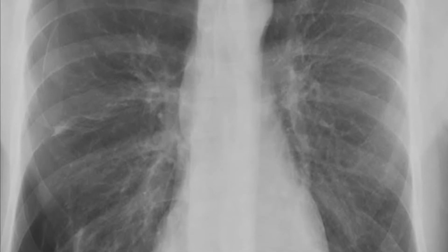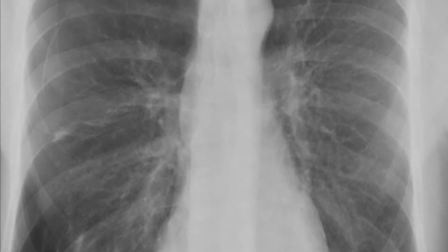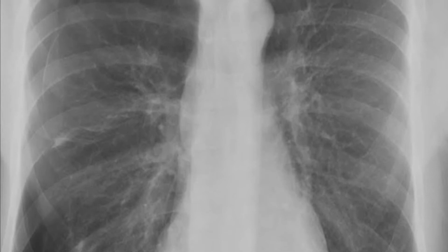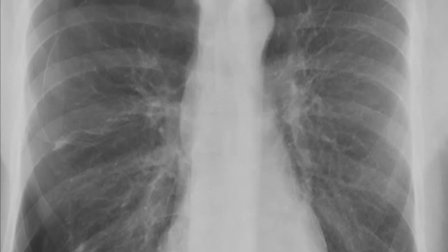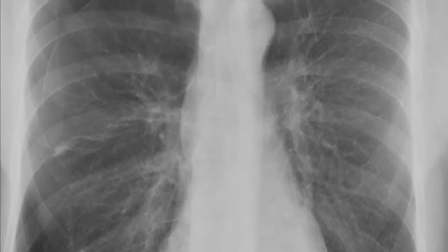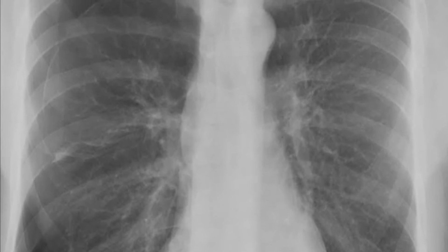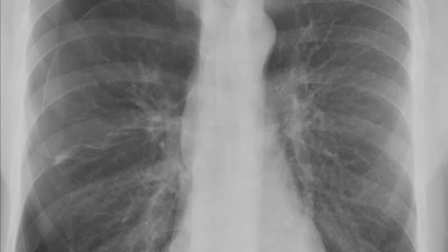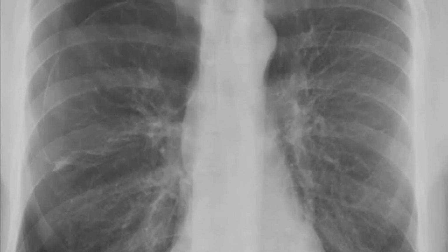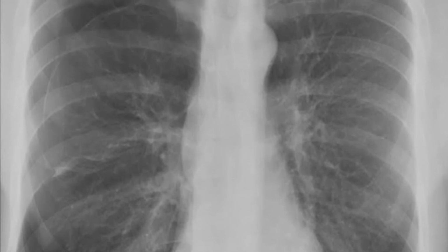For the chest x-ray, there is absent lung marking in the peripheral right hemithorax. A thin, dense line demarcates the pleural margin of a partially collapsed lung. There are multiple areas of atelectasis and approximately 40% volume loss involving the right lung. There is yet to be any significant shift of mediastinal structures toward the left. The left lung and pleural space appear normal. No fractures or free air in the soft tissues is seen. For the treatment, there is urgent chest tube and aspiration of pneumothorax.